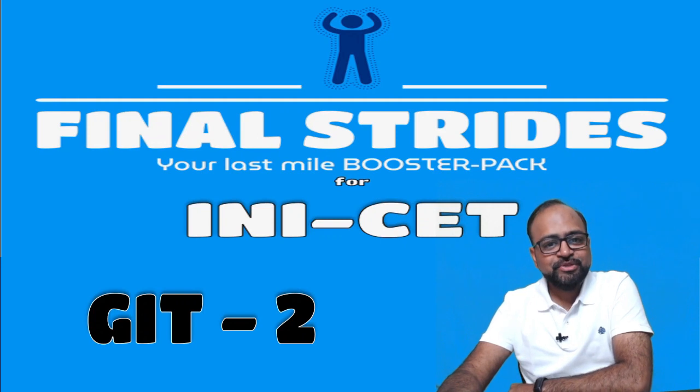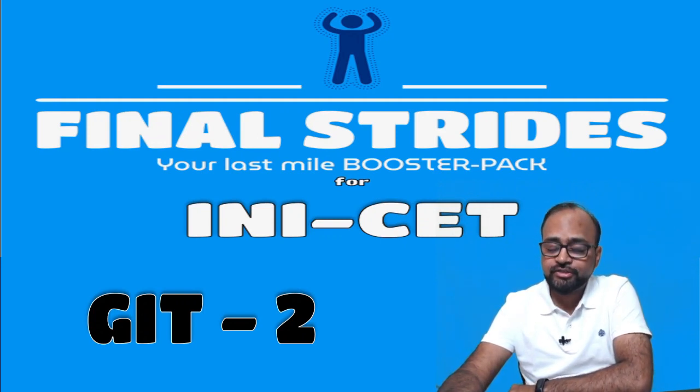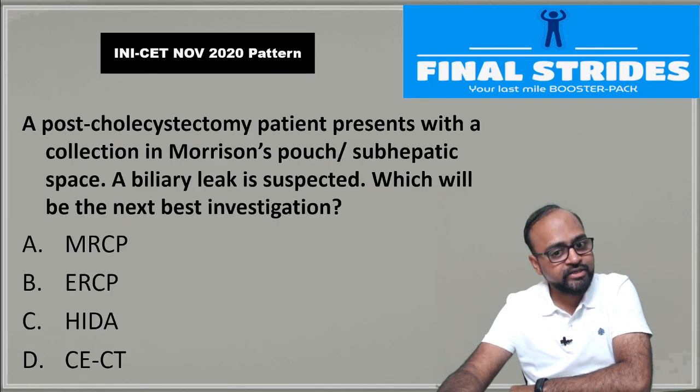Hi friends. So in this session, we are going to focus on a few more classic GI tract related conditions and hepatobiliary conditions. So mainly we are going to look at some bowel spotters and clinchers and focus on hepatobiliary imaging. This is something which is again an absolute favorite topic in your INI-CET exams.